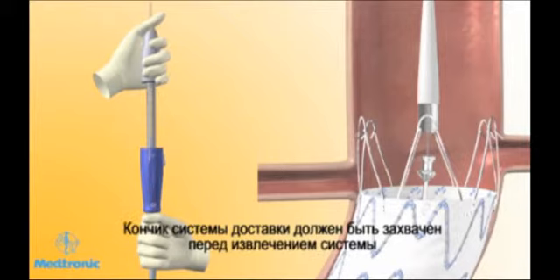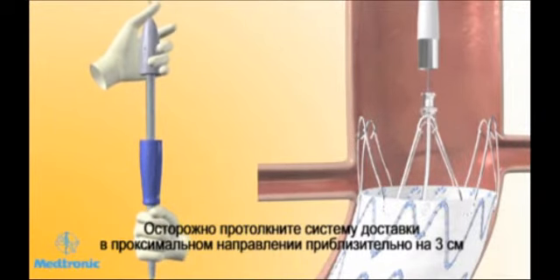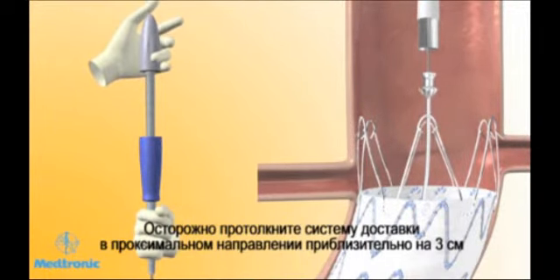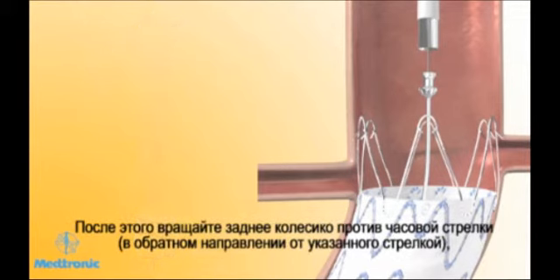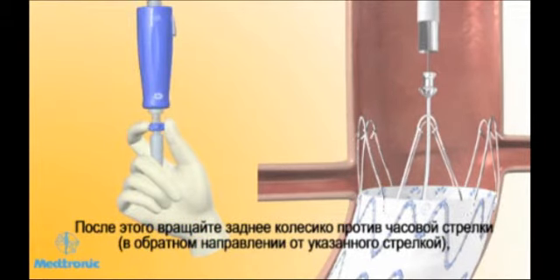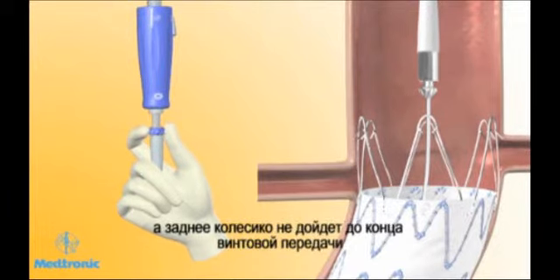The taper tip of the Endurant aortic delivery system needs to be recaptured before removing the delivery system. Gently torque and push the entire delivery system proximally approximately 3 centimeters so that the taper tip and spindle are completely clear of the suprarenal stent. Then, rotate the back-end wheel counterclockwise in the opposite direction of the arrows until the spindle has been completely recaptured in the taper tip and the back-end wheel has been returned to the bottom of the back-end screw gear.